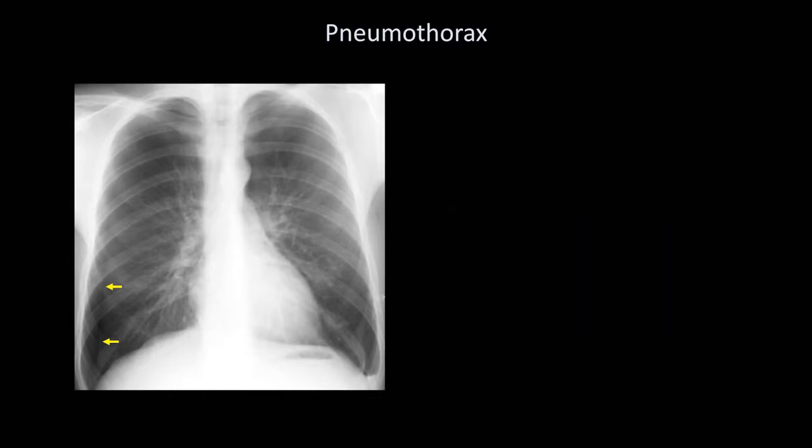Because some smaller pneumothoraces are easy to overlook, there are a few tricks that one can use to make their presence easier to identify. One trick is to compare inspiratory to expiratory films. Obviously, the standard film is an inspiratory one.